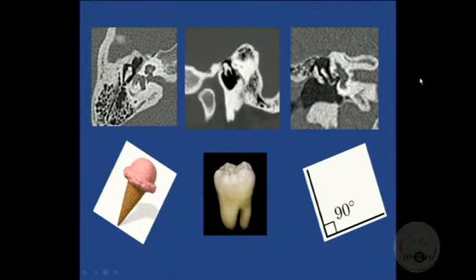Okay. So now you tell me what's the abnormality. Correct. The incudostapedial angle is obtuse. This angle is irregular. And also what else is happening? You're seeing the stapes as a straight line going all the way to the entrance, the oval window. So that's a dysmorphic stapes with an abnormally enlarged incudostapedial angle. Right? So just to give you a sense, that's normal, that's abnormal.